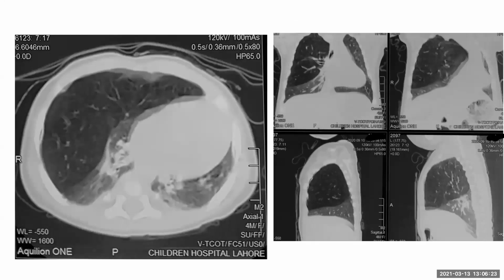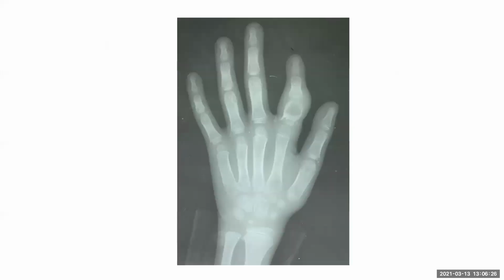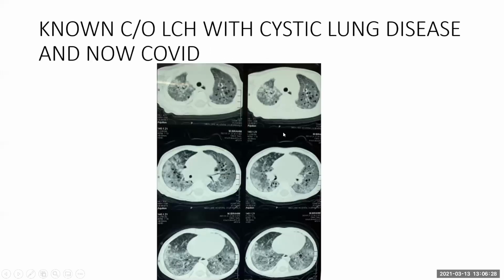No, cystic fibrosis would also not cause a cystic lung disease. That would cause bronchiectasis and thick wall bronchi, which we would see some tubular and some end on with signet ring appearance. As for LIP, no, that won't give such an appearance. I haven't seen such cysts in it, and the typical peripheral opacities are not seen in that. The ground glass haze is seen, but that is more like a mosaic, I think.